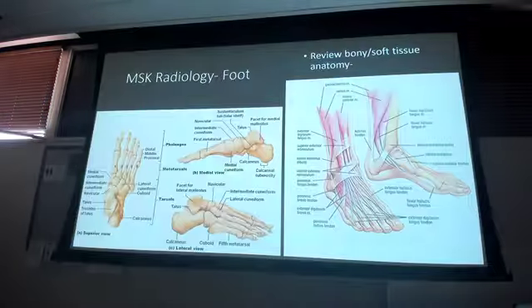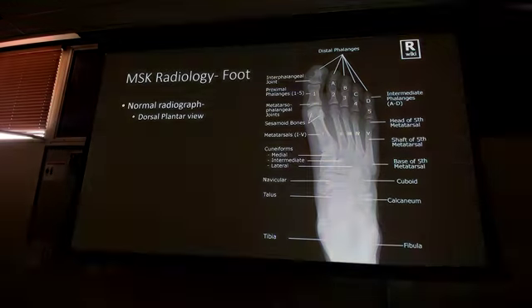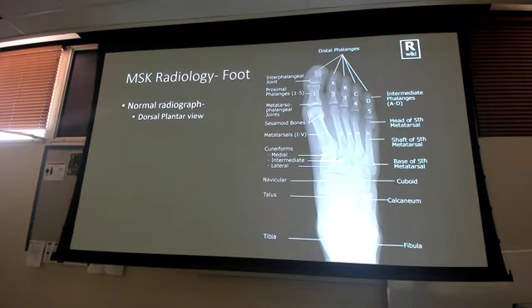Okay. Foot anatomy, x-ray. A little bit different here, but kind of like the wrist in the aspect to where I can make out my medial and my intermediate cuneiforms. Lateral's kind of hard to tell because the cuboid kind of goes over it. I can see my navicular, but like I was saying, look at my talus, right? It's kind of hard to make out here. Hard to make out the talus sitting in these areas. You can make out the first two cuneiforms, but not necessarily the third one, right?